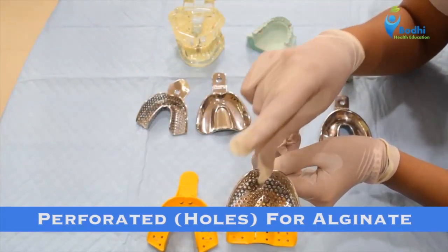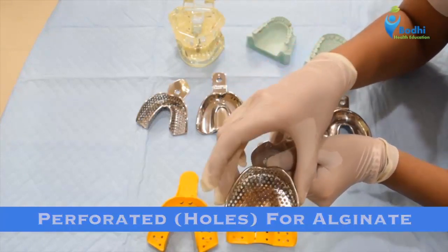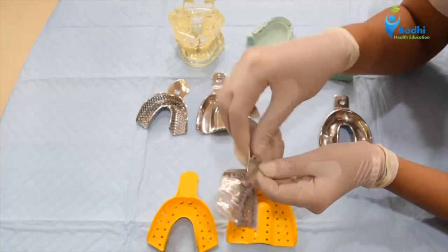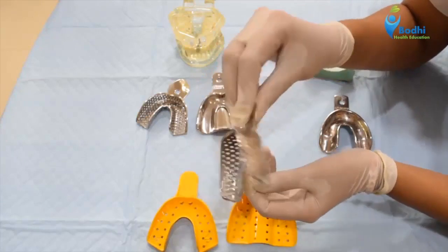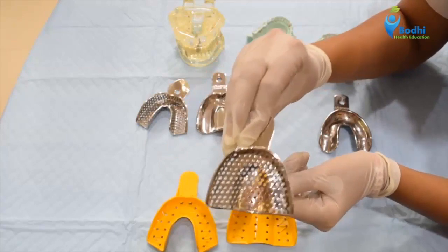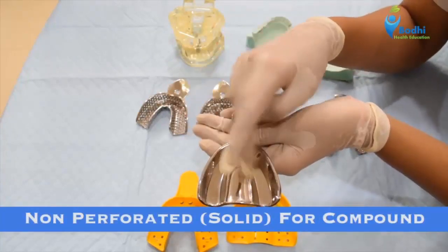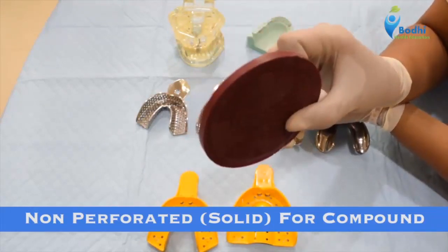When recording, the impression material should stay in the tray. The impression should not dislodge from the tray. So the mechanical locking of the impression material into the tray can be easily achieved with the help of these holes. Materials like alginate do not stick to the impression tray. So alginate impressions should always be made in these perforated impression trays. The material of choice for these solid non-perforated impression trays can be the impression compound.